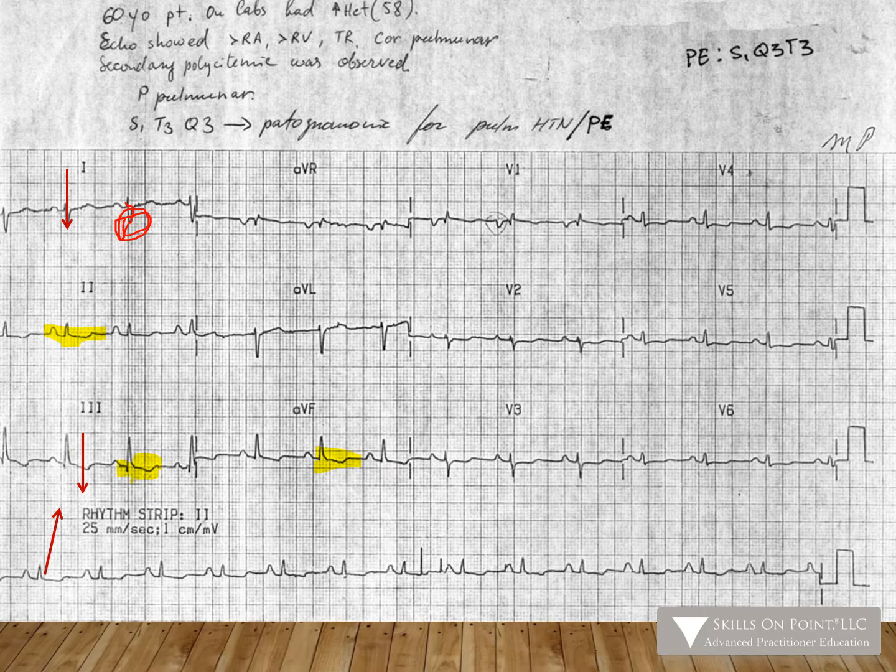Part of the process here is just going to be looking through and getting a good diagnostic of those 3 things. And if you see them, it doesn't mean you have a PE, but it does indicate it's pathognomonic for elevated pressure in the pulmonary artery, which backfeeds into the RV. So pretty much going to be a slam dunk if you have someone with acute onset of chest pain and you go, okay, that makes sense.